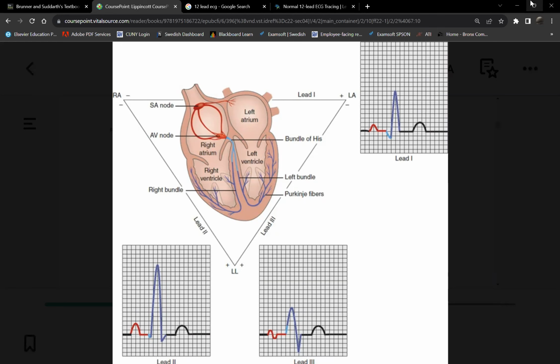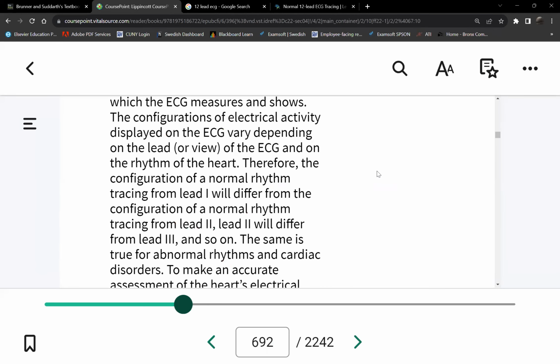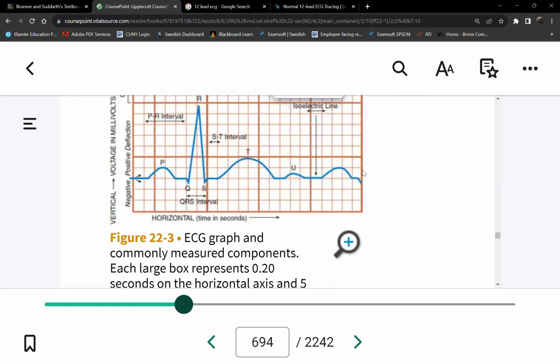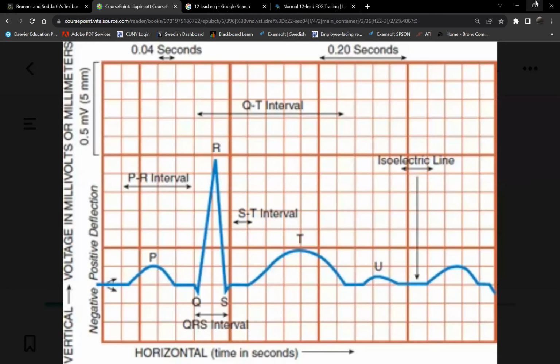It did not. So the proof here is the PR interval. Okay, so there is a delay, correct? Because if you think about it, it's the same electrical impulses causing the entire heartbeat. However, if that happened, then the QRS and the P wave will actually happen at the same time, right? If you think about it. But is that what happened? No. There's a moment here before the ventricles contracted.